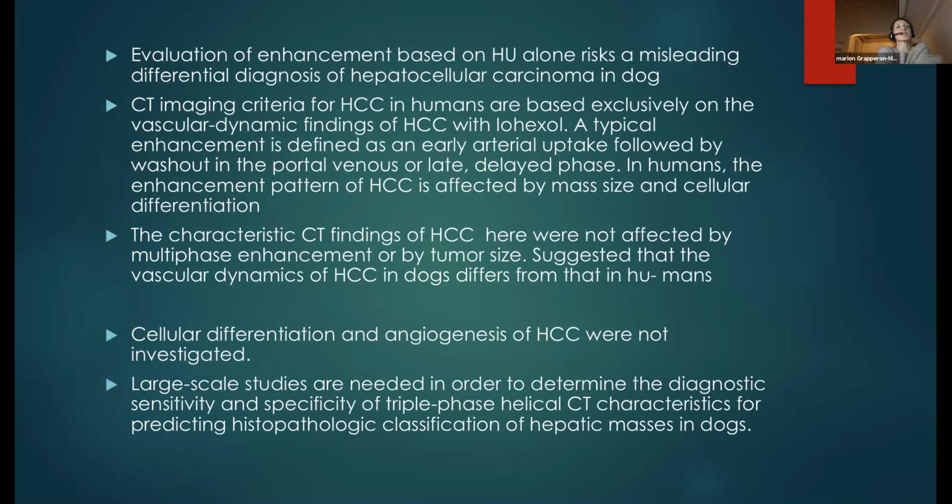attenuation values as well in portal and delayed phase. So the main part of the discussion was that you cannot just look, of course, at the Hounsfield unit, and you need to compare to the surrounding parenchyma and also the behavior in a dynamic way. So it really shows that the triple phase CT, the dynamic evaluation, is very important.